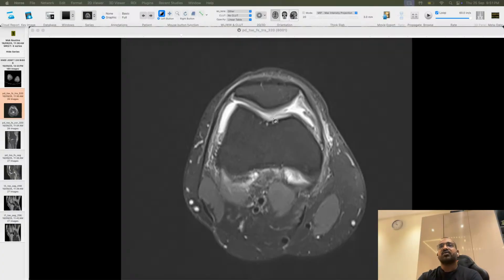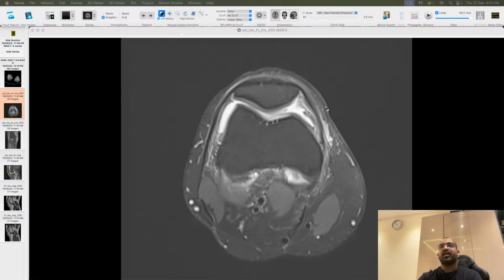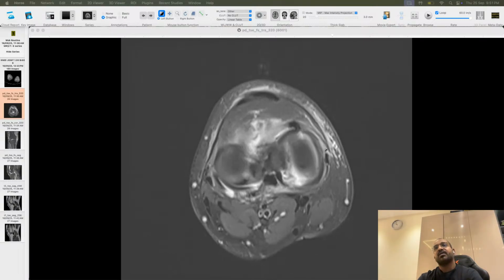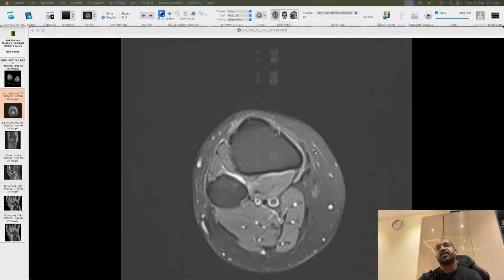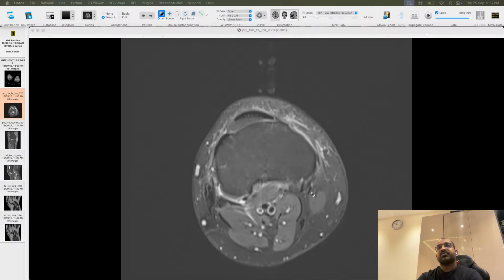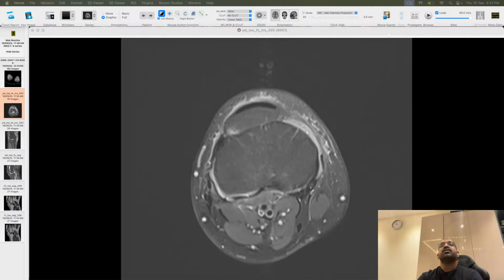Patellar cartilage overall looks good. And there is edema or sprain of medial and lateral patellar retinaculum. If you see, mild fluid is there in the anteromedial aspect of the knee joint in the subcutaneous plane. As we mentioned in the previous videos, this is our pes anserinus bursa. There is minimal fluid, but no significant inflammation seen in the pes anserinus bursa right now.